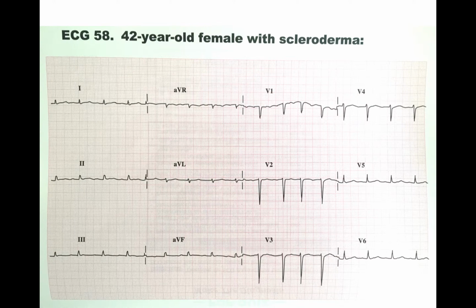So, as far as an overview of this patient and pericardial effusion, you typically see the low voltage QRS, you see the electrical alternans, especially if it's complicated by cardiac tamponade, and you may also have other features of the acute pericarditis, such as the diffuse ST elevations, a patient that just doesn't look well, and the sinus tachycardia. So that's it for this patient, and thank you.